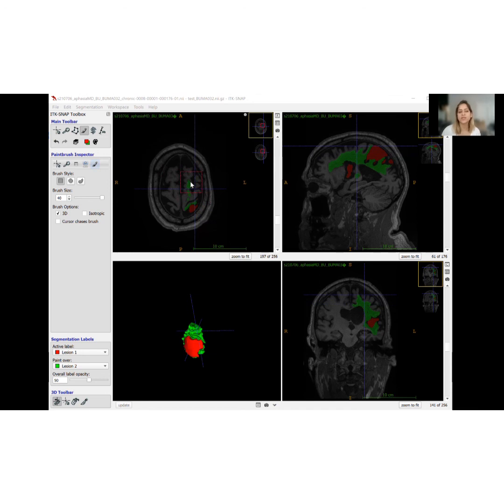Yeah. So just to add this, if you take this map and you save the segmentation here, we've tried that. So going to segmentation, save the lesion map. We found out that if you take it out to, for example, MRIcron or other tools, your map is not binarized. So we want a binarized map of 1 where the lesion is and 0 elsewhere.